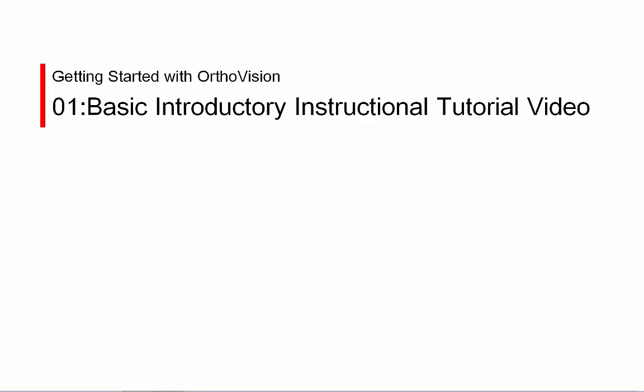Welcome to the basic introductory instructional video for OrthoVision. In this video, we will be going over how to open OrthoVision and how to add a new patient.